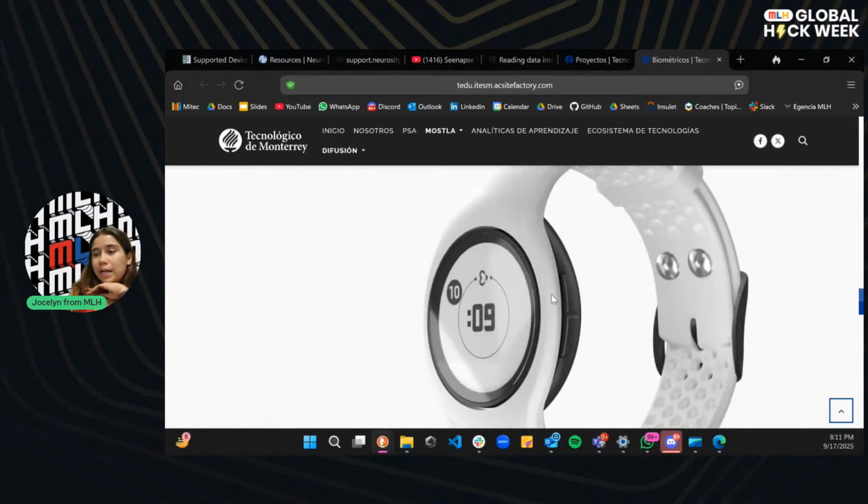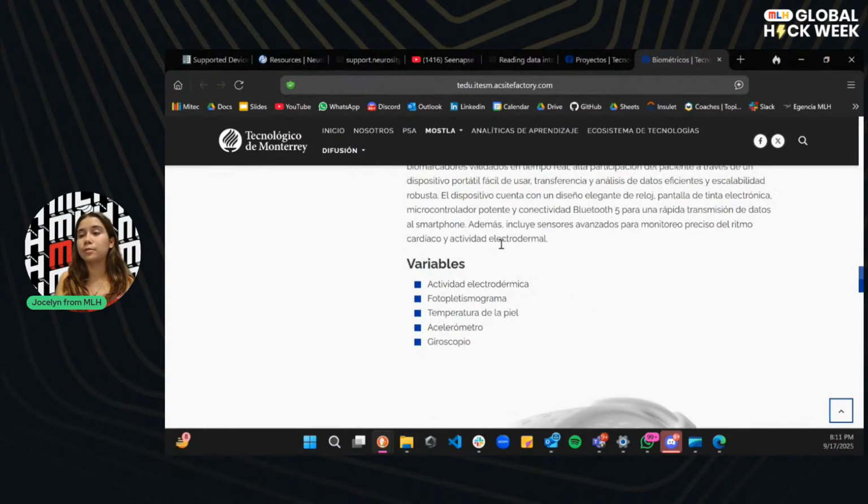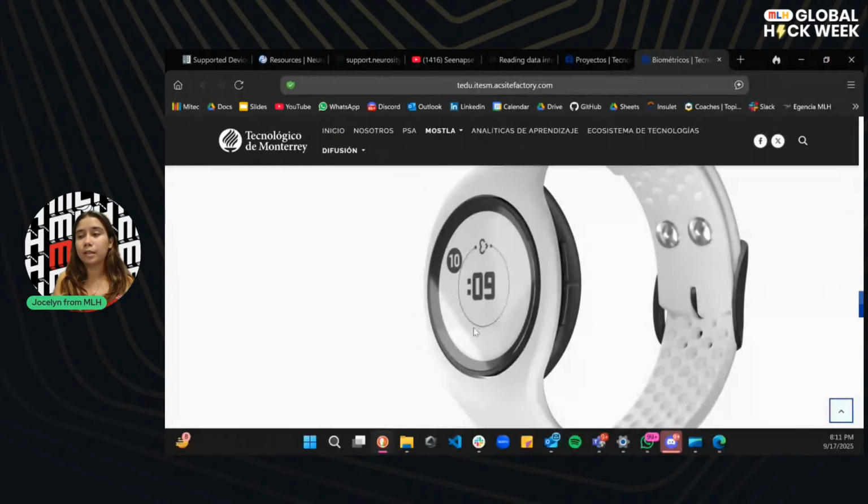For this one, I actually built third-party software, so you can obtain the direct files from here and visualize them on a Streamlit dashboard, because it was really hard to get these files to work through their own software. It was not beginner friendly. So my goal was building a dashboard that was easier to understand, so users could actually use it correctly.